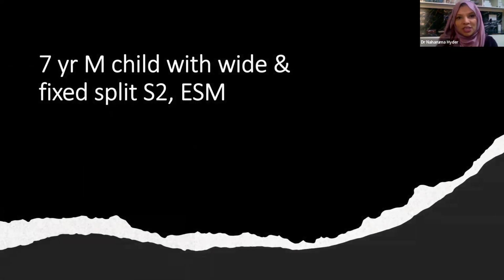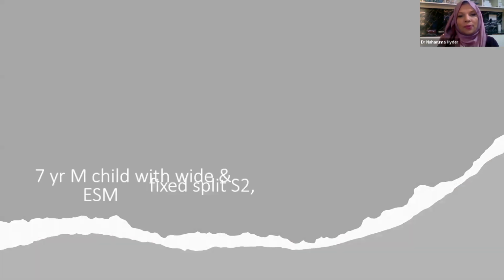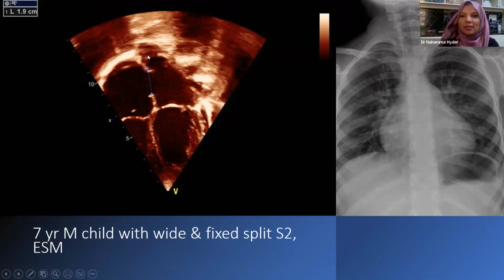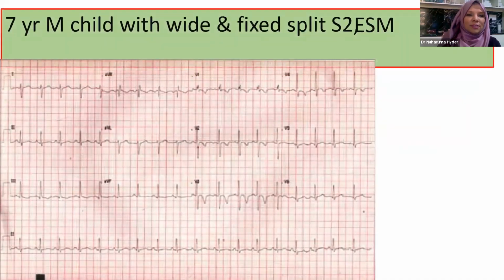I am starting with a scenario: a 7-year-old male child with a wide and fixed split of the second heart sound, having an ejection systolic murmur. This clinical feature tells us some story. In echo we found a mid septal defect at the atrial level, and in X-ray there is right atrial enlargement and cardiomegaly with some form of increased pulmonary blood flow. So this is the ECG of this baby.